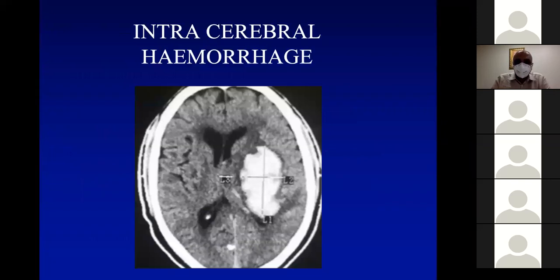Intracerebral hemorrhage. Again, as I've shown you before, this is acute blood. This is in the region of the left lentiform nucleus, and while reporting, somebody has measured it as well. This is surrounded with this black vasogenic cytotoxic edema. This is causing compression and mass effect over the left lateral ventricle with slight midline shift. If you draw a straight line from anterior to posterior, you would see that the midline septum is slightly deviated to the right side.